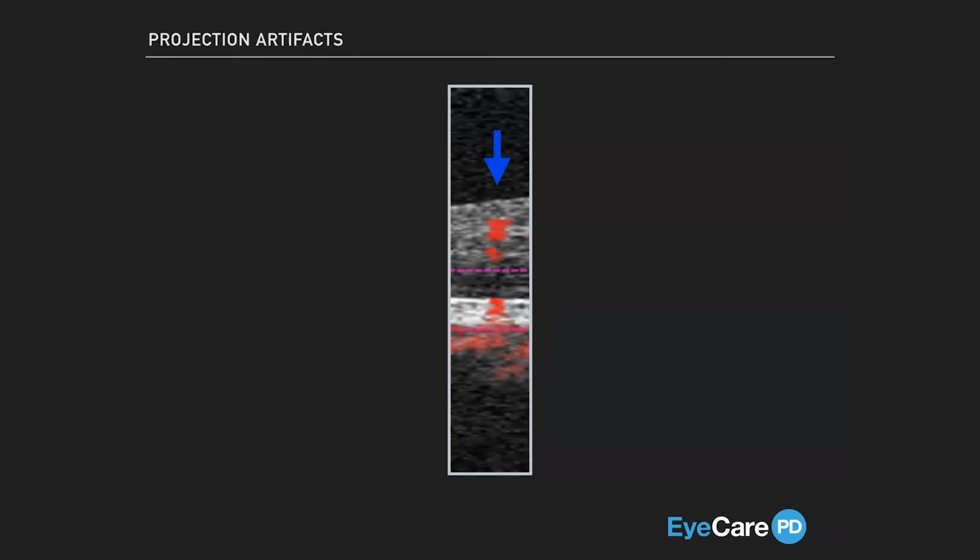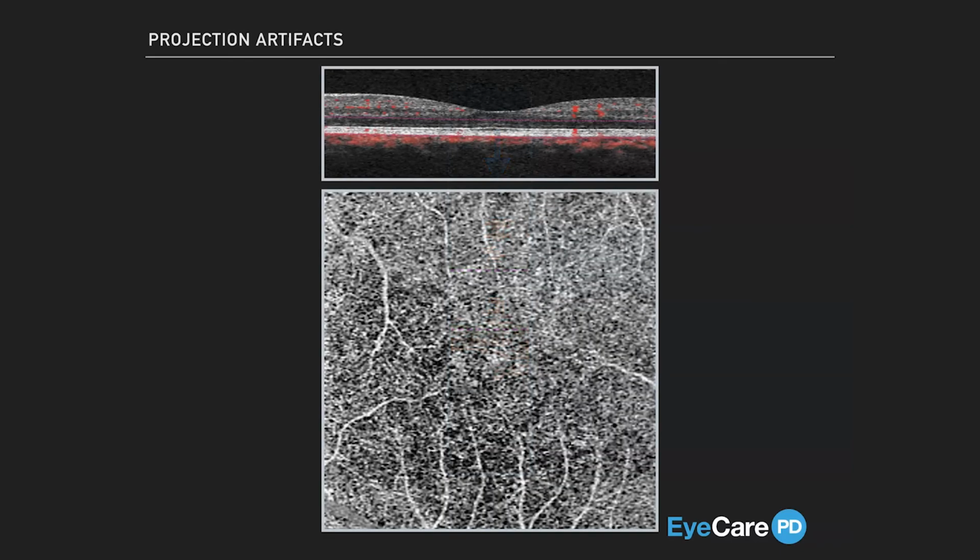Fortunately, most OCTA devices can use image processing tricks to remove these artifacts in the deeper layers and thus clean up the OCTA images. However, the devices are rarely perfect, and being able to recognize these artifacts is important to prevent erroneous diagnoses. Now, instead of showing you structural B scans, we are going to look at slabs, which is how we typically view OCTA data.